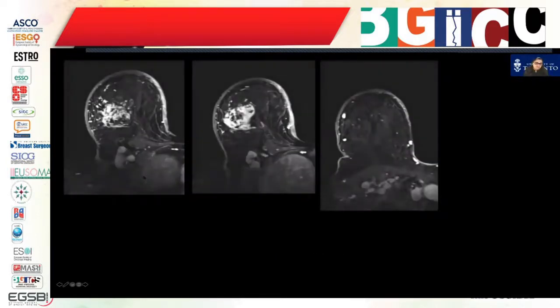Here's a very nice example to show you these different groups of lymph nodes in a woman with a fairly large breast cancer. These are the level 1 lymph nodes, which are lateral to the pectoralis muscles. Again, you see it lateral to the pectoralis muscle. As we go higher up, you start seeing the pectoralis minor. So these are the level 2 lymph nodes that are posterior to the pec minor, and these are the level 1. And as the lymph nodes start going medially, they start becoming level 3.